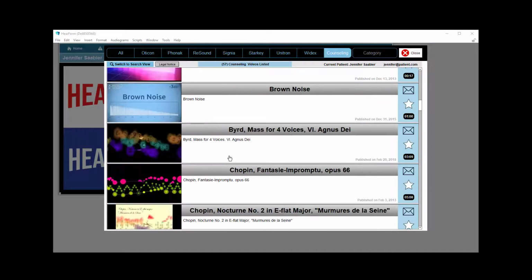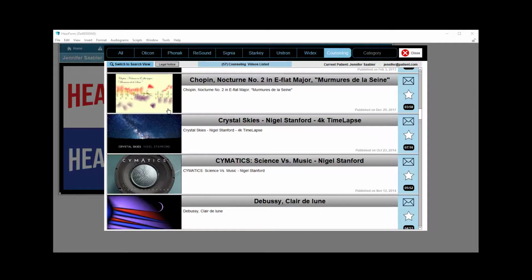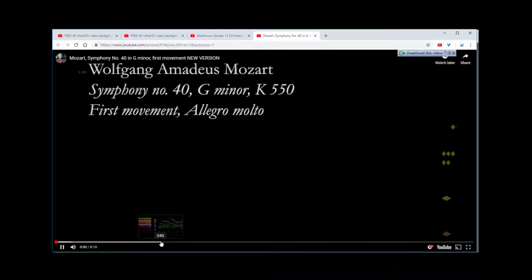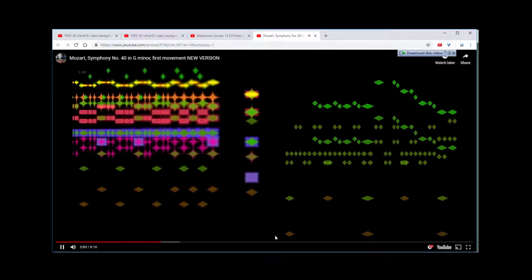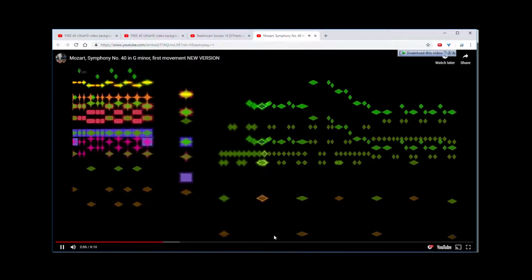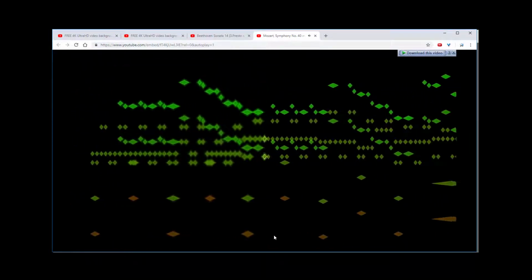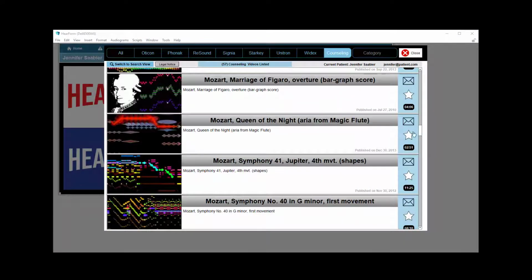I'll just show you a couple others because I really enjoy them. Just play around with these different ones here and you'll see that there's some really nice stuff in here. So I'll click here, and this is just a nice way for, as we turn on the sound. Anyway, I won't belabor that too much, but you might find some of those tools to be very helpful.